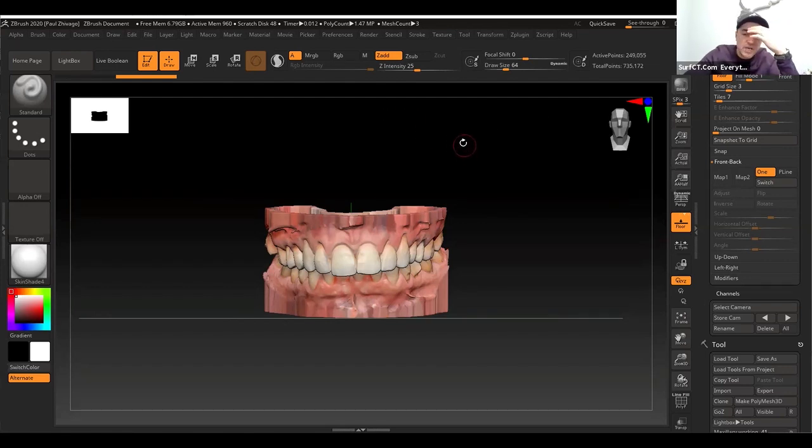Now, to have them projected, I took the pictures, did screenshots, I put them in PowerPoint or Keynote presentation, aligned them based on transparency, and cut them out for the same exact size. One with the design smile, and the other one is with the smile that we took without the design.